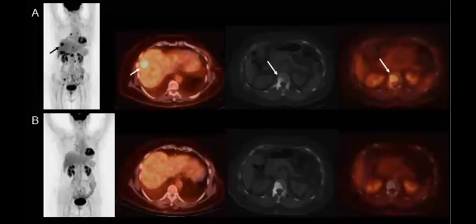So let's say this patient has primary breast cancer and he had treatment. So this is what you are expected to mention, that he has complete metabolic response. CMR means complete metabolic response.